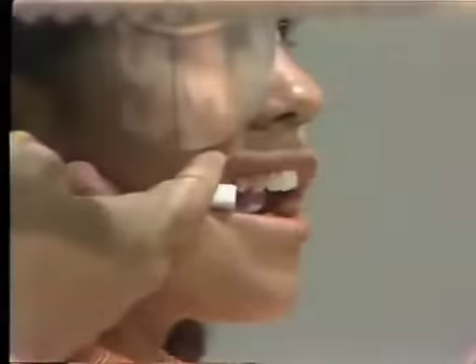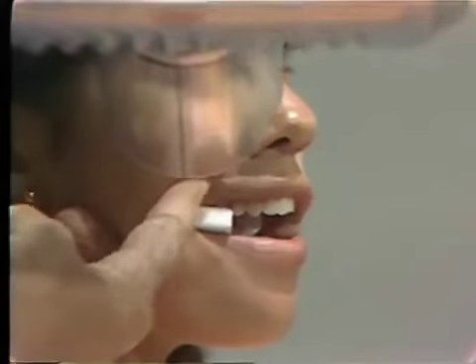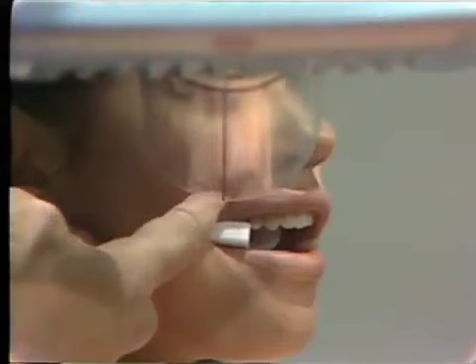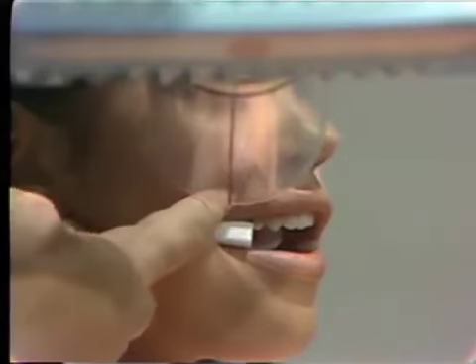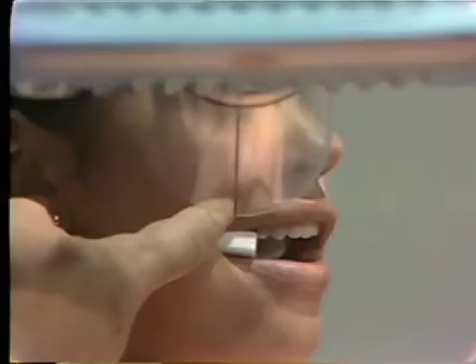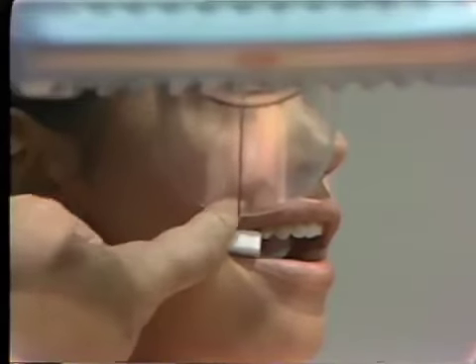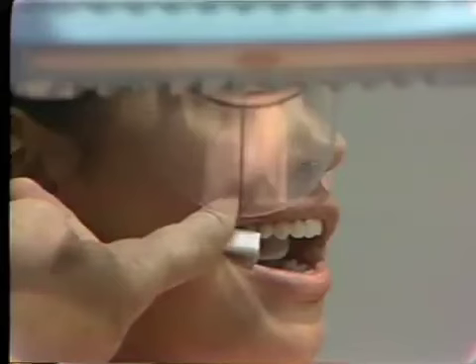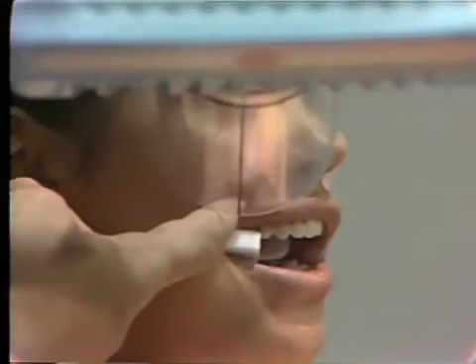Now, for this one, I want to direct the central ray, the black line on the underside of the cone, toward the center of the block, which would indicate somewhere near the center of the film, and with a direction that hopefully would open contacts. Now, if we can't sight between the teeth too well, we can fall back on the alternate method of lining up the buccal surfaces of the teeth parallel with the end of the cone, or vice versa.